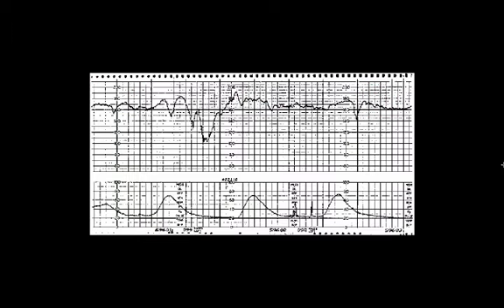We're going to come back to this strip for just a moment so that we can look at contractions. In each strip, you need to understand how that strip is set up. For these strips, each little block is 10 seconds, and it's a little more difficult to see here, I know. But when we're looking at contractions, we're trying to determine from the beginning of one to the beginning of the next. How far apart are they? So what I would do is visually say, this is 1 minute. So from here to here, 1 minute, 2 minutes, about 2.5 minutes. From this contraction, it's 1 minute, 2 minutes, 2.5 minutes.